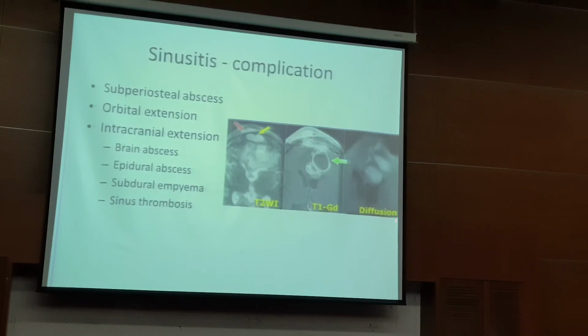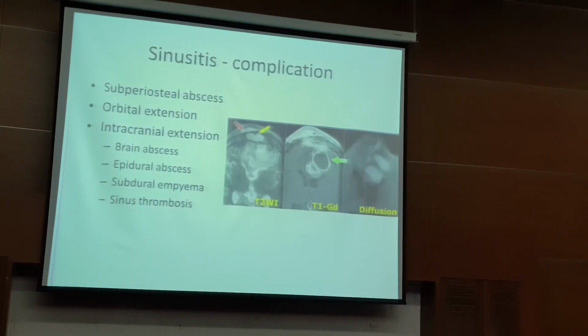And this is a sequence that we use to diagnose abscess. This is very important when we see restricted diffusion in an abscess. When we see restricted diffusion, it means an abscess, and it is caused by bacterial infection. Non-pyogenic abscess will not cause restricted diffusion. That one is a little bit complex, but for now, because most of the time sinusitis is caused by bacteria with complications, this is an abscess. This is restricted diffusion, high on DWI, and it has to be low on ADC.